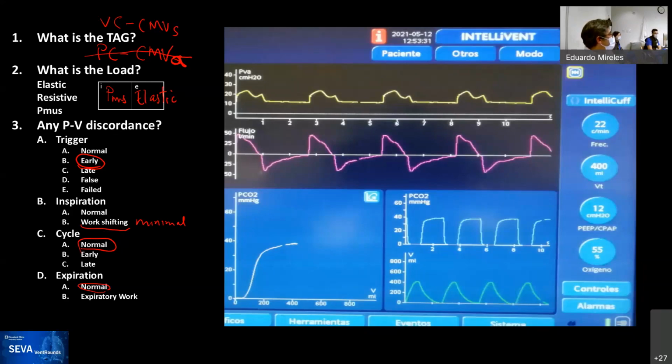There's an element up there that's related. I'll cross it off for you too. Not there. If this was a Servo U, I would have said this is circuit compensation. I'm not aware of this function and what it leads to in terms of waveform on the Hamilton.